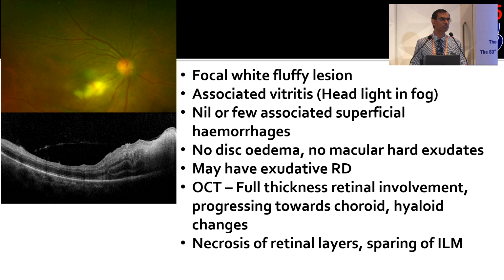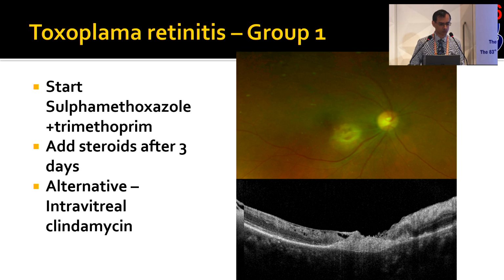And now some people in toxo have also described this detached layer of hyaloid. Under that detached layer of hyaloid, if there are focal thickenings seen with retinitis, people have ascribed it to toxoplasma again. So under this hyaloid, if you see these focal areas of thickening, with this white area, people have talked about it as toxoplasma.